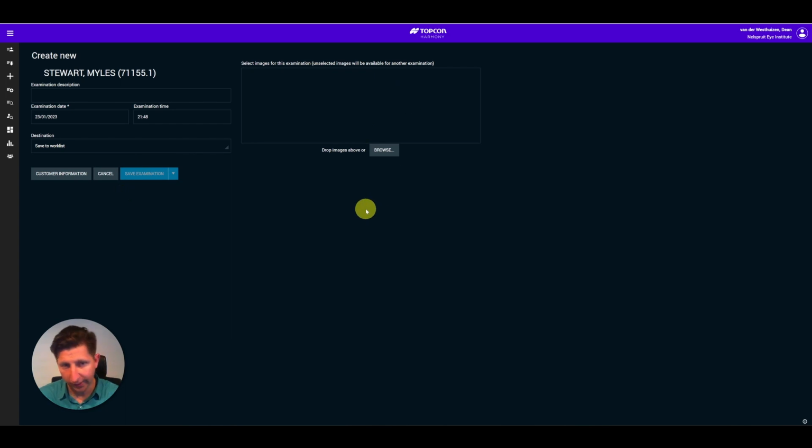So you can take maybe written notes, you can take an image, you can take a visual field that someone's walked in the door with, maybe it wasn't done digitally, and you can add it and tag it so that it belongs under that patient's name. So you can ensure, even if you do have some paper-based notes or old visual fields, or the patient has any physical copies, you can really put anything in here, images, PDFs, etc. So that's also quite useful.